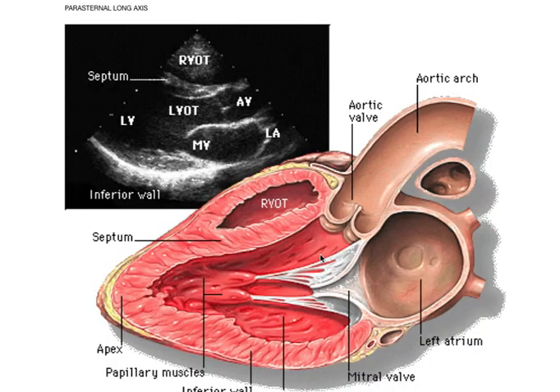And this is what it looks like. Just another schematic of this. In the parasternal long axis, we can see the left atrium goes into the left ventricle through the mitral valve. This is the anterior leaflet of the mitral valve, sometimes called the septal leaflet because it comes up next to the septum during diastole. And this is the posterior leaflet of the mitral valve, and this is the aortic outflow tract seen right here, and then the right ventricle is seen up here, or on the ultrasound, LA, LV, aortic outflow tract, RV. The apex of the heart is seen down here.